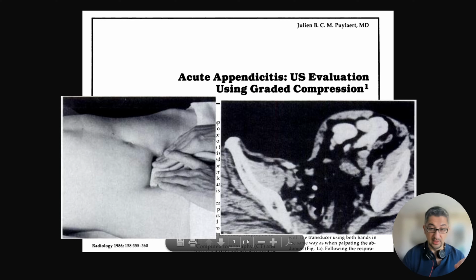They even showed this with a CT study, the effects of compression and how it displaces the bowel loops. This is the most important piece, because in most cases where we cannot see the appendix, if you do enough compression, you can find the appendix. It's not always possible.